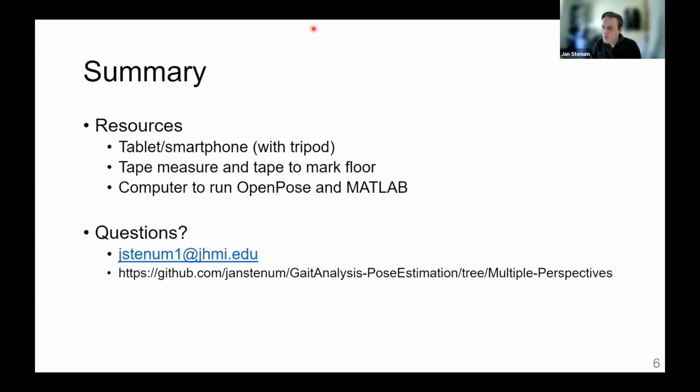For the sagittal workflow, it is not a requirement because we would still be able to get step lengths from that. For the frontal plane workflow, that would be an issue because all the spatial parameters are based off of the size of the person, and if that's not changing on the treadmill, we can't. We need that translation in space in order to get those parameters. So that wouldn't work with treadmill walking, but the sagittal workflow will work.